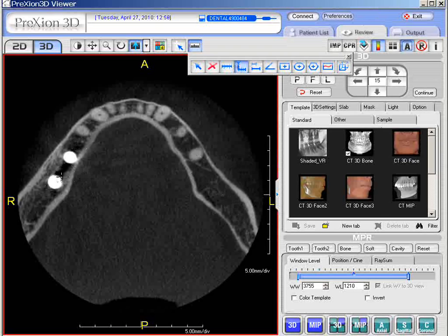Once the caliper is in place, left click it. So we're just going to the outer edge of the border of the implant. We're going to left click it to the next edge. We're going to click it again and just go across the transverse portion of that particular implant, left click it again, and go to the other resident tooth that is in place. With a double left click, we get a total of that section. And then when we click the total section, we can see the segments between each individual segment that we measured. So you have the ability to use the line segment if you want to use it in that regard.